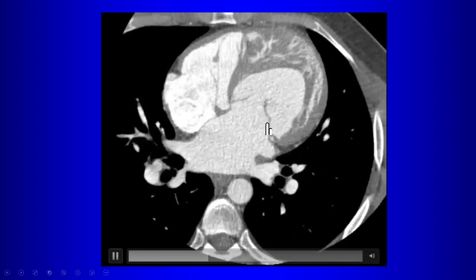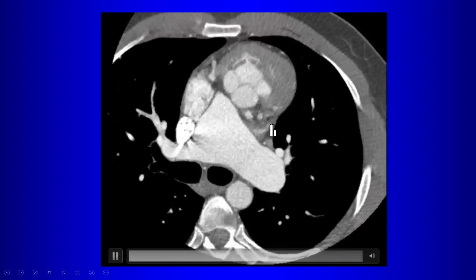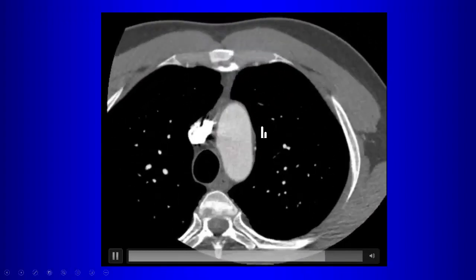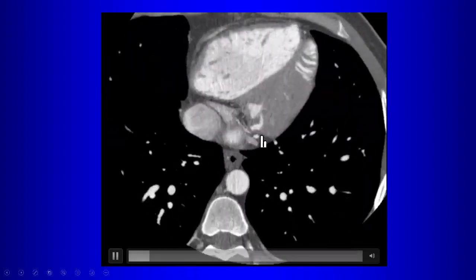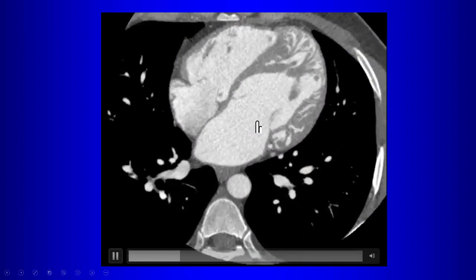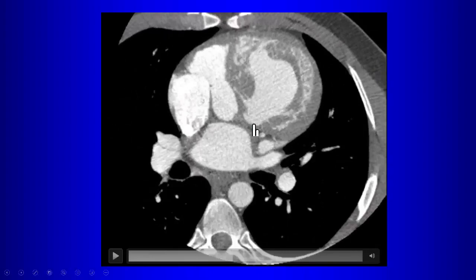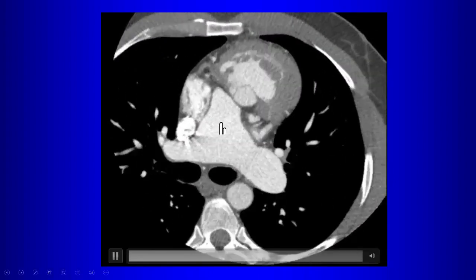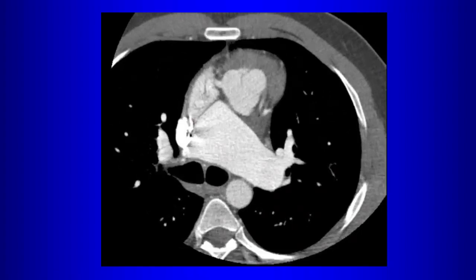And we have ventricular arterial discordance. What is this condition called? No. This is L-transposition or congenitally corrected transposition. Right? And one key to making this diagnosis rather quickly is if you look at the relationship of the ascending aorta to the pulmonary artery. What do you notice about the position of the aorta relative to the pulmonary artery? Anterior and to the left.